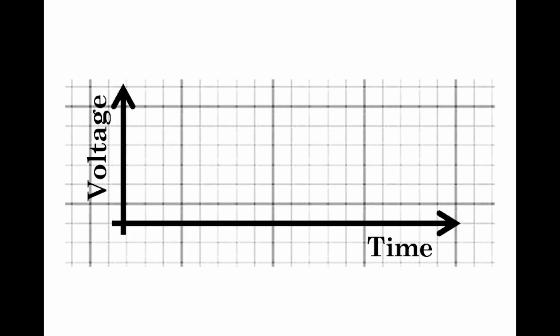In this video we will talk about paper speed and calibration. The ECG is printed on the paper with a grid. The horizontal axis represents the time. The vertical axis represents voltage.